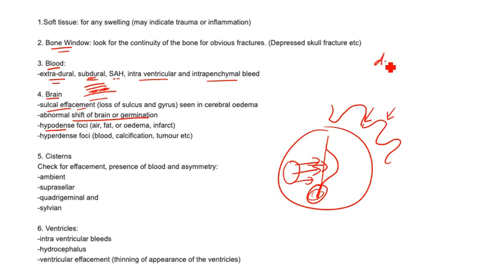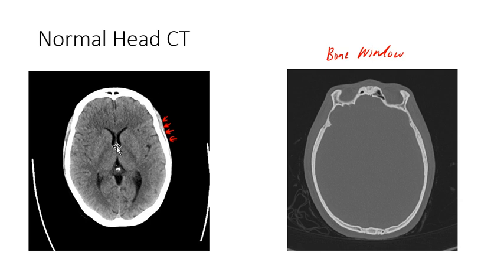We talk about density. If we say hypodense, it simply means that the area is dark, so black. Hyperdense denotes white discoloration. Let's look at this. You can see this area that is black here; we call it hypodense.